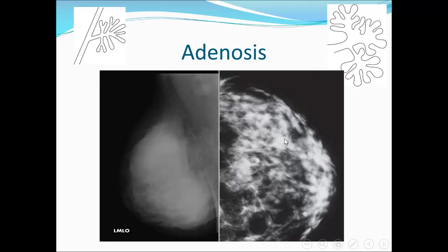Okay, when to say, like, this is an intramammary node. Note here, this is the fatty hilum, and this is the intramammary node. We will see it on later films.